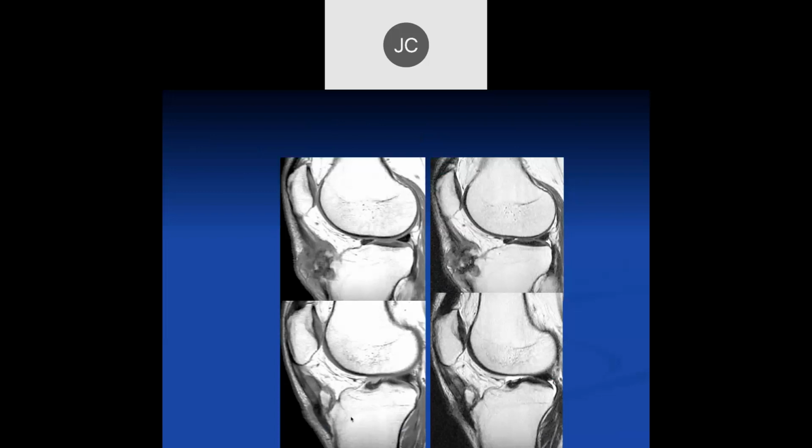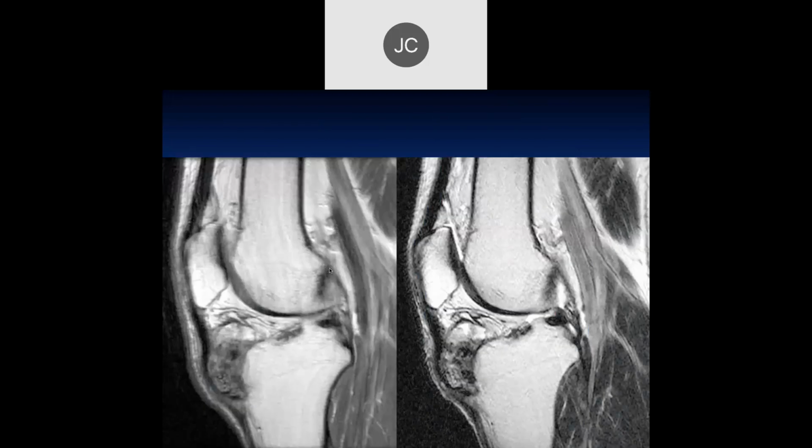Here's a more severe case. If they continue to injure this and not allow it to heal, the body tries to heal itself, then you tear it more and you get more scar tissue, and you can really get large masses here if patients are non-compliant and don't allow this to heal. Rest, and more rest. This is an extremely common condition in children, especially boys. So here at that tibial tuberosity, there's just mixed signal.